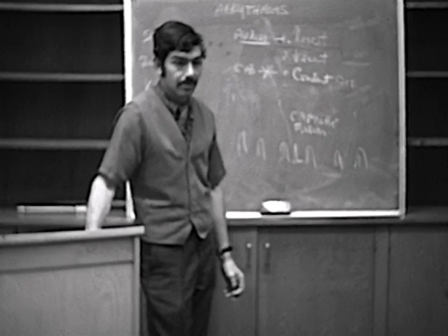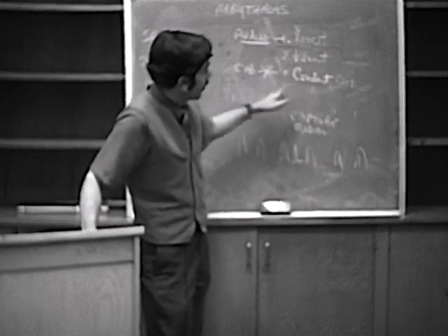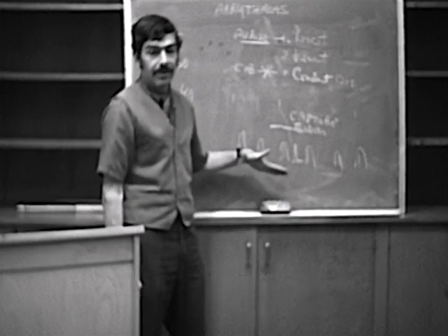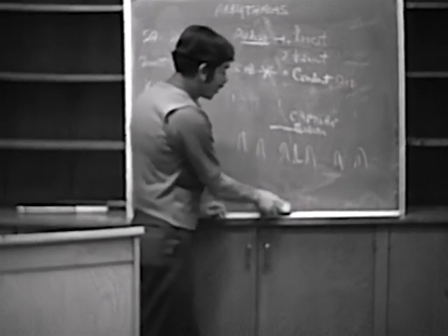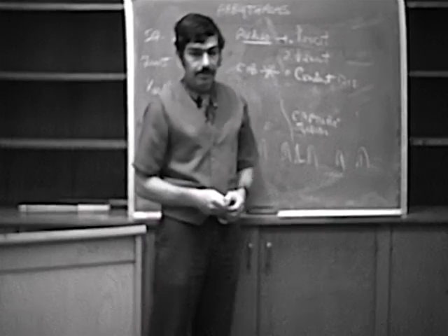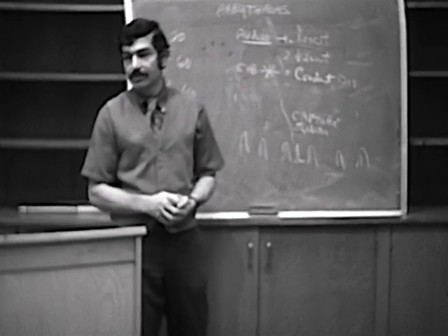Okay, but you see the basic idea is that in complete heart block, you have a disturbance of conduction. Here's the atrium, here's the ventricle. In complete heart block, nothing is getting through. You see that? Whereas in AV dissociation, all the impulses could get through, but the lower focus is beating the upper one to the punch, so to speak.